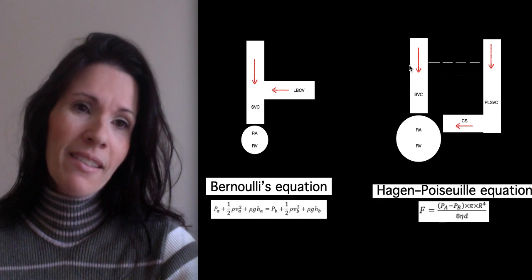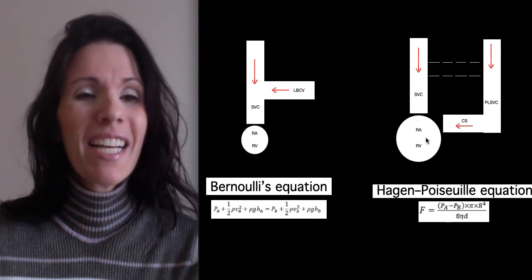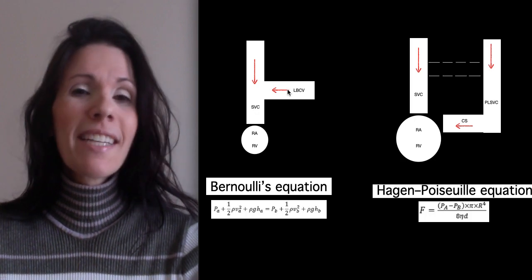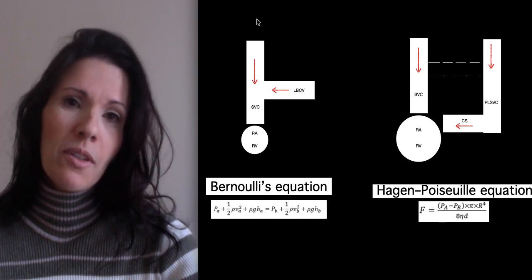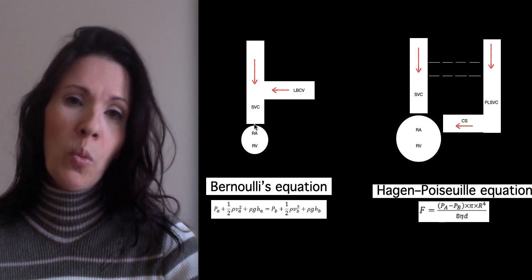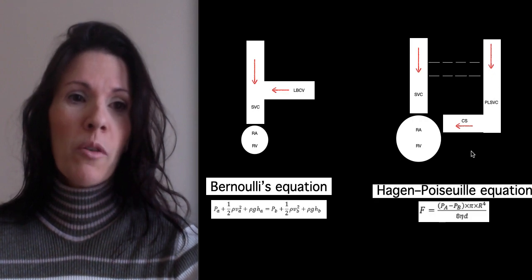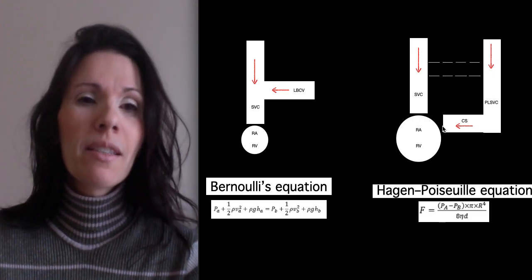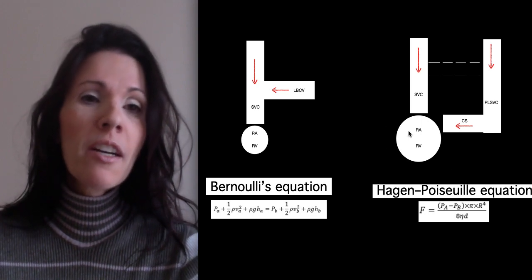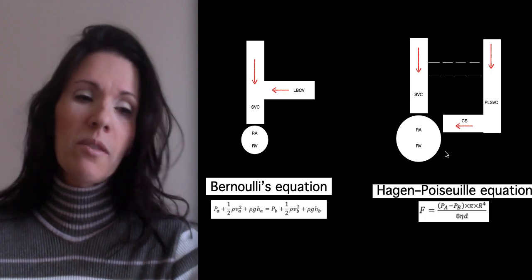vein. You cannot understand these equations, but I understand it like this: it's a kind of funnel. In the normal case, the blood comes to the heart through just one door, and here you have two doors, and you have more pressure, more blood, more volume, and that makes the right chambers bigger than the normal heart, like this one, okay?